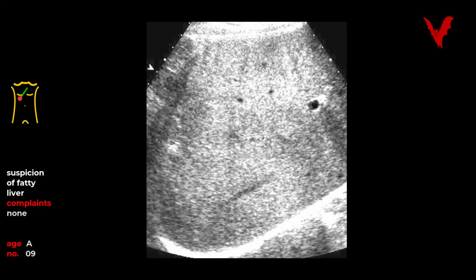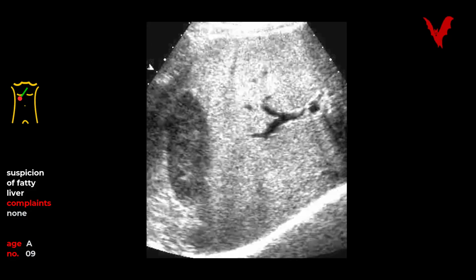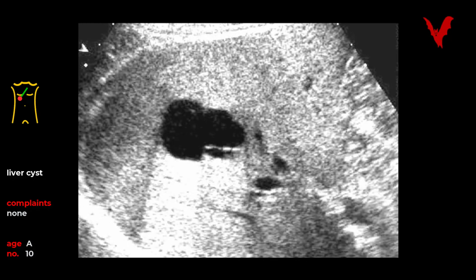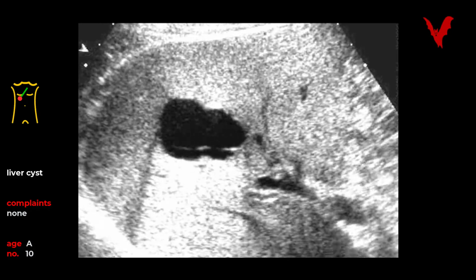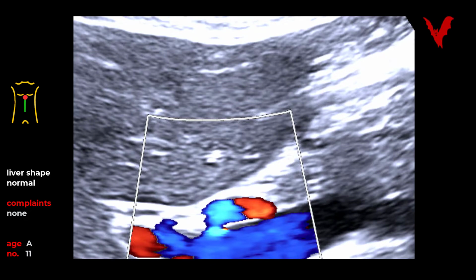Another example of enhanced liver echogenicity is here in figure 9. Please compare to kidney echogenicity. Number 10 is an example of a liver focal lesion. It is simply another cyst. Sharp margins of the organ indicate normal volume. Pathology in here will be discussed later.